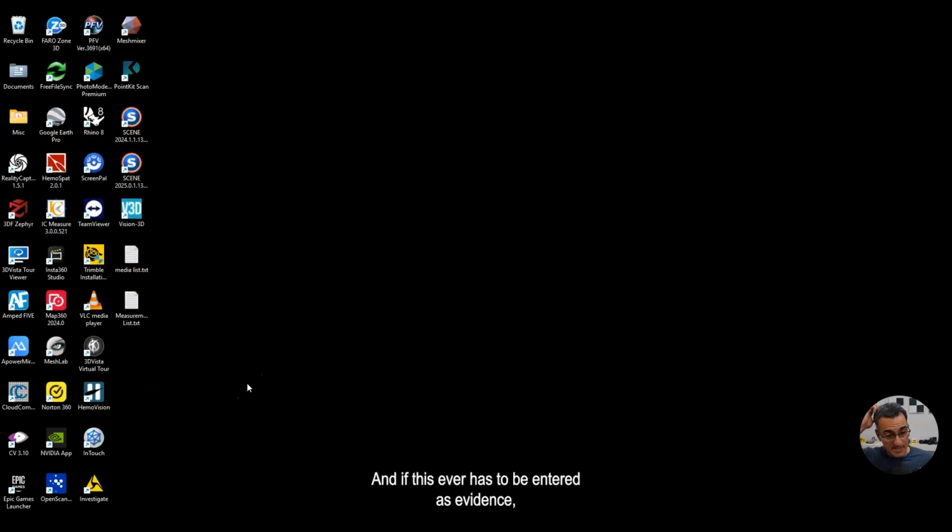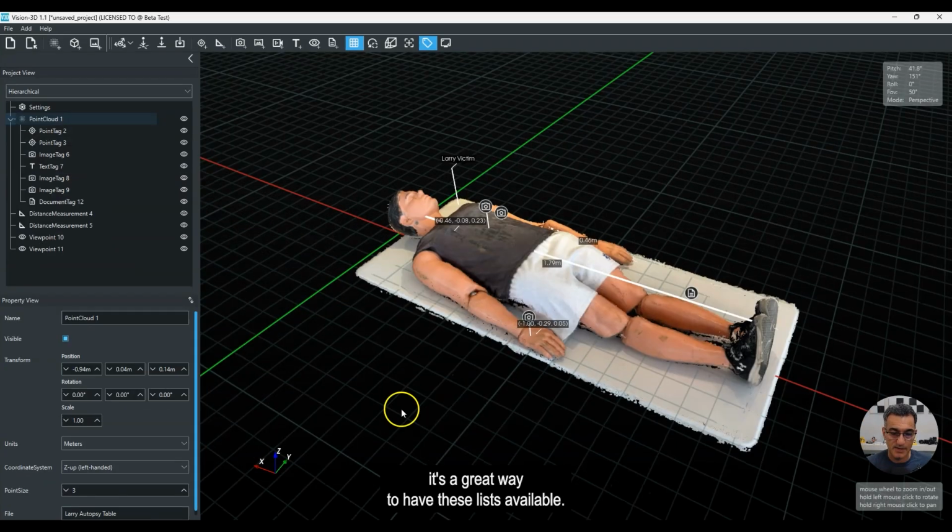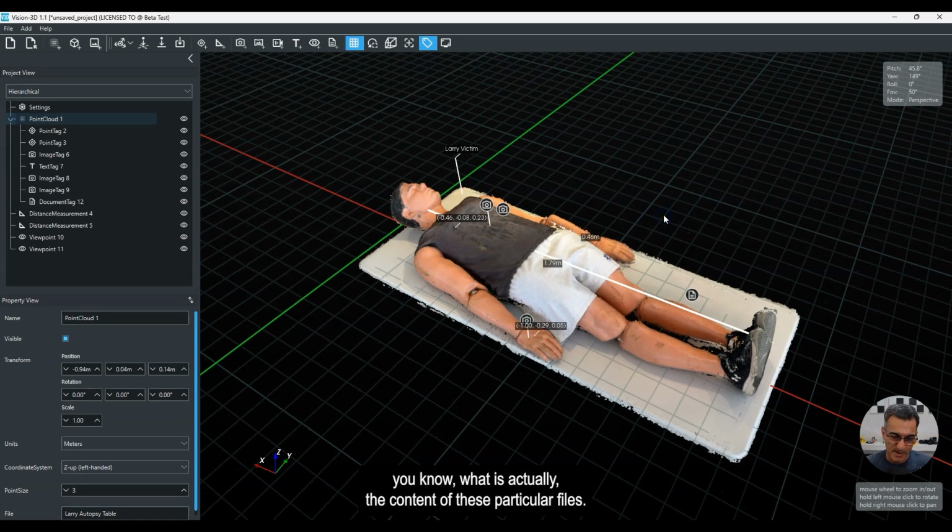And if this ever has to be entered as evidence, it's a great way to have these lists available so everybody knows what is actually the content of these particular files.